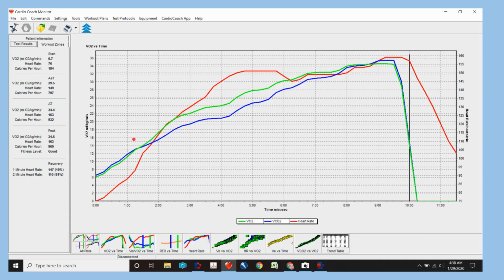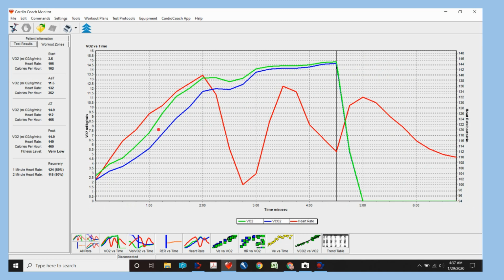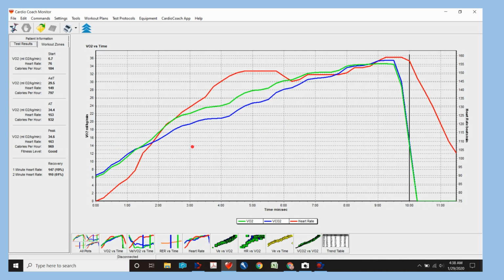If we back up, we'll see, oops, let me go back to her. We'll see on this one a 14.9. So it really did affect her score, and so that is obviously what we want to look at. Let's see if I have another one.